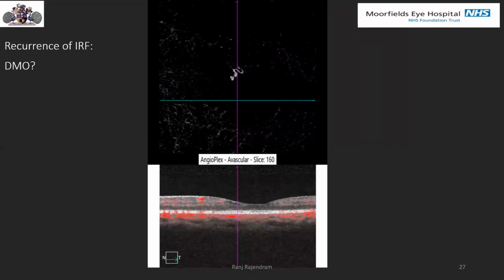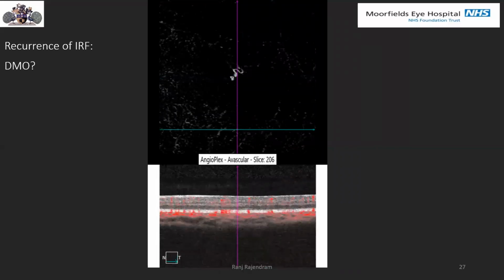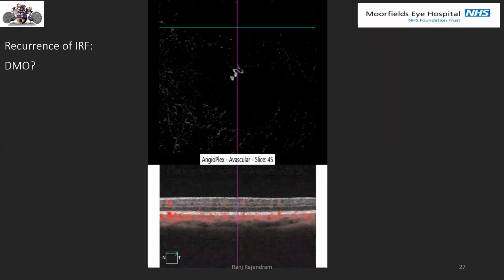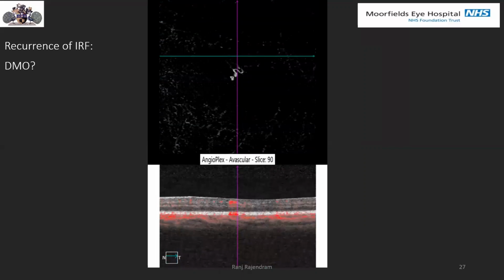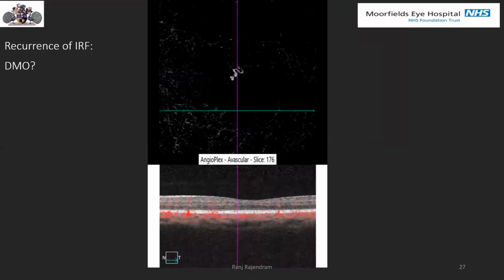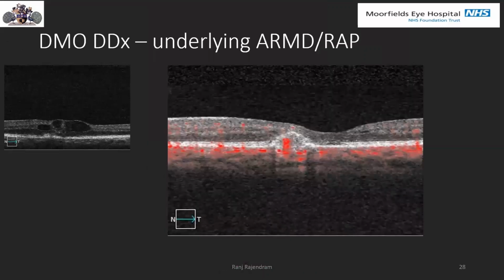If you look at the PED when it comes through, the vessel has dipped down into the retina, and you'll see there's some flow across that as well. Here we go. So if we look at the flow there, we can see there's flow coming down through the retina and to the RPE. And here we see it. So that's a, you know, diabetic patient who's elderly. That can happen for sure. They've got some RPE disturbance, but they've had a RAP lesion develop over time. So it's important to discuss that there could be co-pathology going on with this patient.